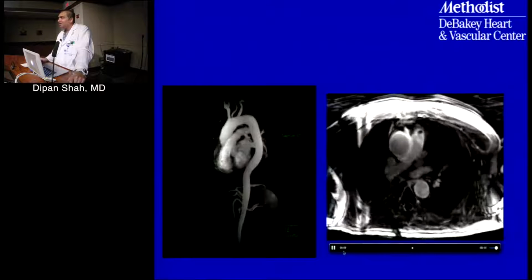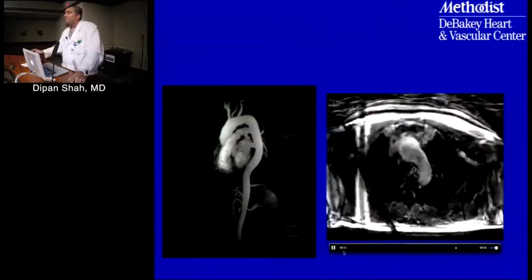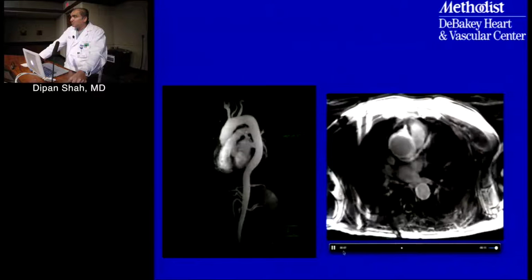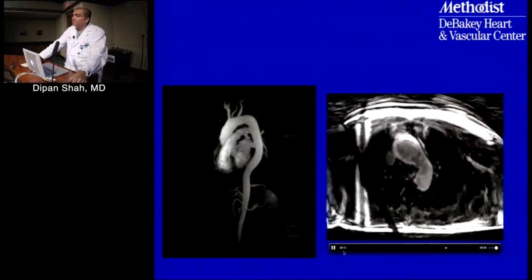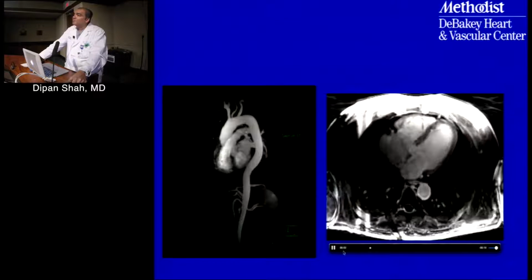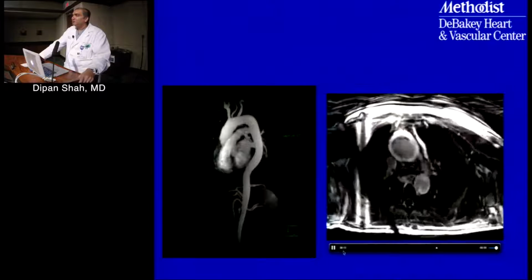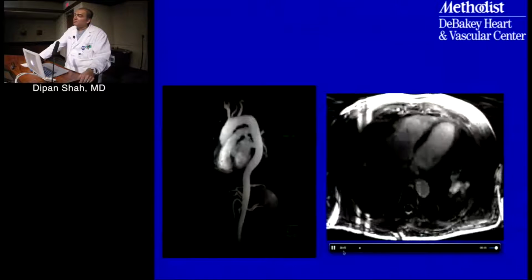I think Bill, yes, Bill, you know this patient. He had a PET scan, which is part of the reason that we were concerned. And now, follow-up of 3 years. Yeah, because last time we imaged him was about 2-3 years ago. So 3 years, the aorta has not changed. The aortic wall is a little thinner, right? Much less uptake on PET.